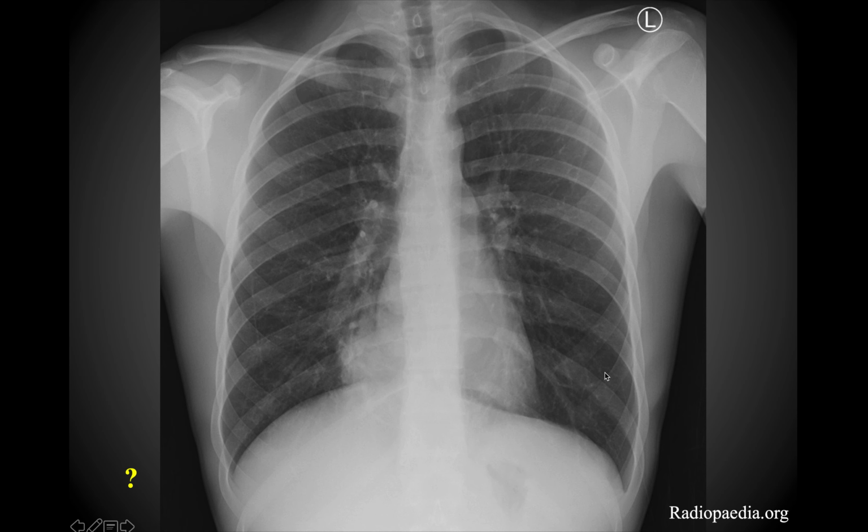Okay, this lecture is going to cover just a few more abnormal chest x-rays, and then we're going to talk briefly about ultrasonography of the thorax as well. So take a minute to look at this chest x-ray and see if you can figure out what the abnormality is based on your knowledge of normal thoracic anatomy. And again, you might need to pause since I'm not going to wait too long on the video here to move on.